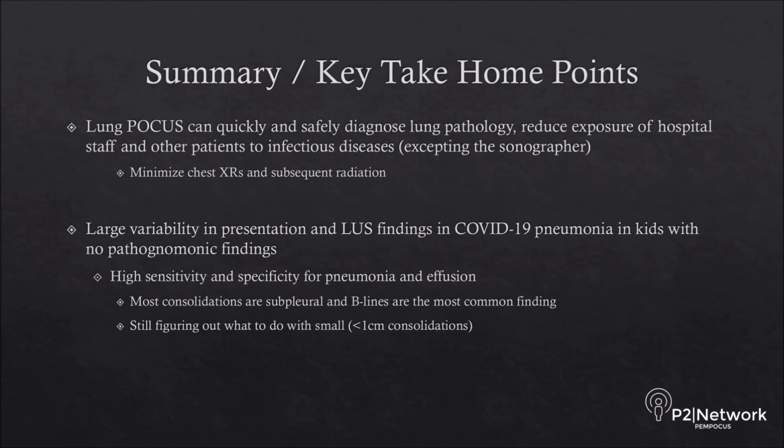So in summary, lung POCUS can quickly and safely diagnose lung pathology, reduce exposure of hospital staff and other patients to infectious disease, except of course the sonographer. And this can help to minimize chest x-rays and subsequent radiation. And it's also easier to clean and has a smaller footprint in the hospital.